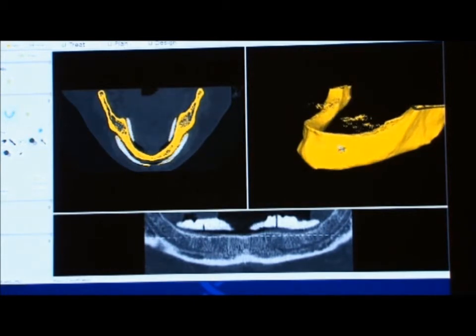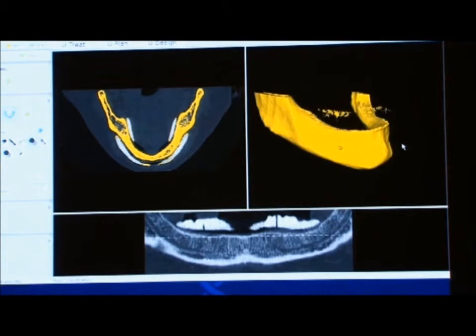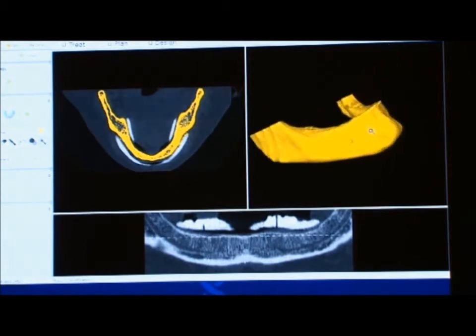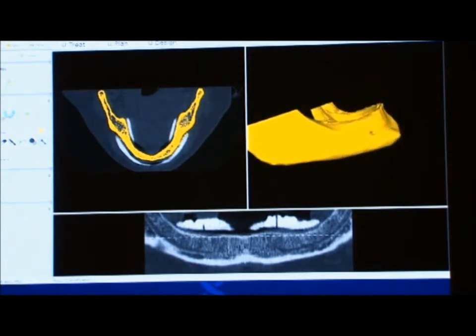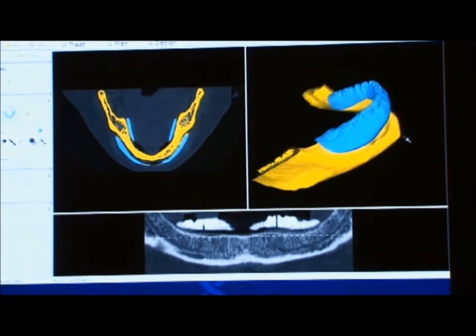I am going to use the magic wand. The magic wand is on the left side. I select the guide, I click on this, and when I click on the bone, it removes automatically all the other images which are not linked to this. Again, the tools are simple to use. That's the objective. The objective is to get tools that we can easily use.